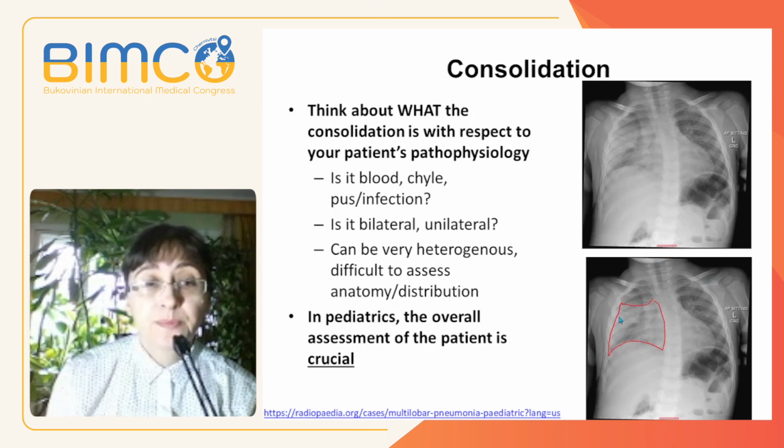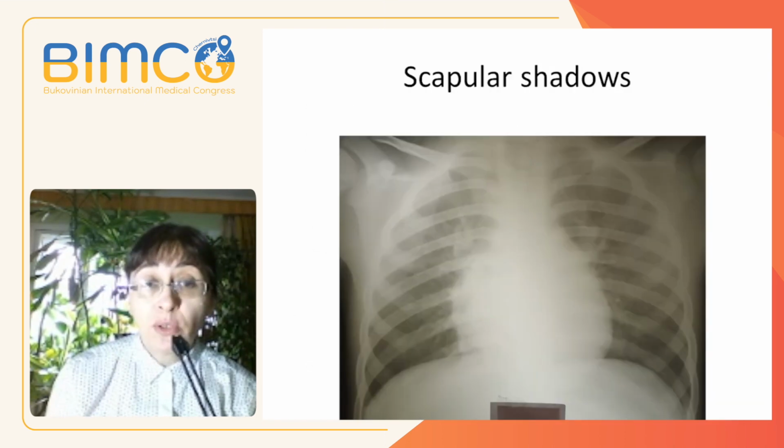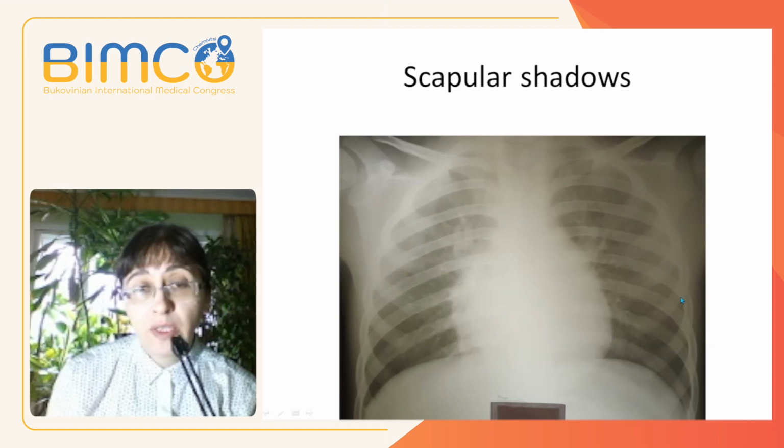Very important in pediatrics is to take into account the overall assessment of the patient, but also not to mix it up with other shadows. With consolidation, you have to rule out the scapular shadows on both sides, visible here, for example.